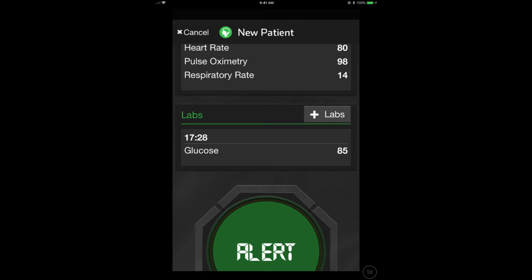Images may be added to the case as well. One important image to consider capturing is the patient's driver license. This can assist the emergency department in registering the patient into the hospital system as early as possible. Additional images to be considered are medication lists.